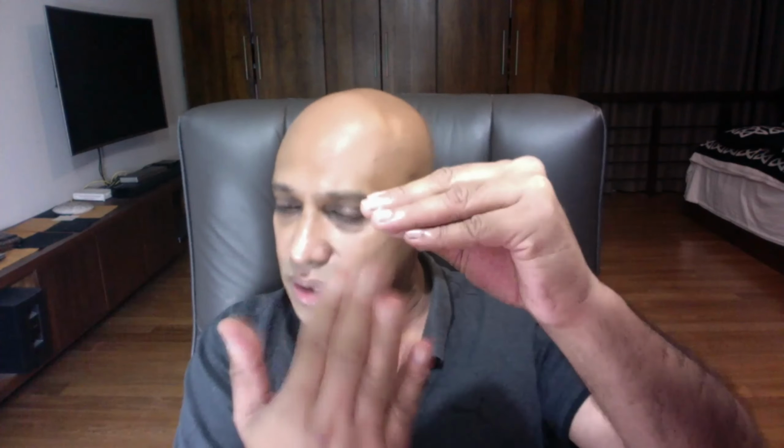And what happens is, when there is an electric current between those, these special ceramic crystals can expand, and then when the current is off, they come back to normal. Depending on the voltage and the frequency, it can do this. Okay, so it compresses the air in front of it. And what happens? Compression, decompression, compression. So it creates an ultrasound beam.